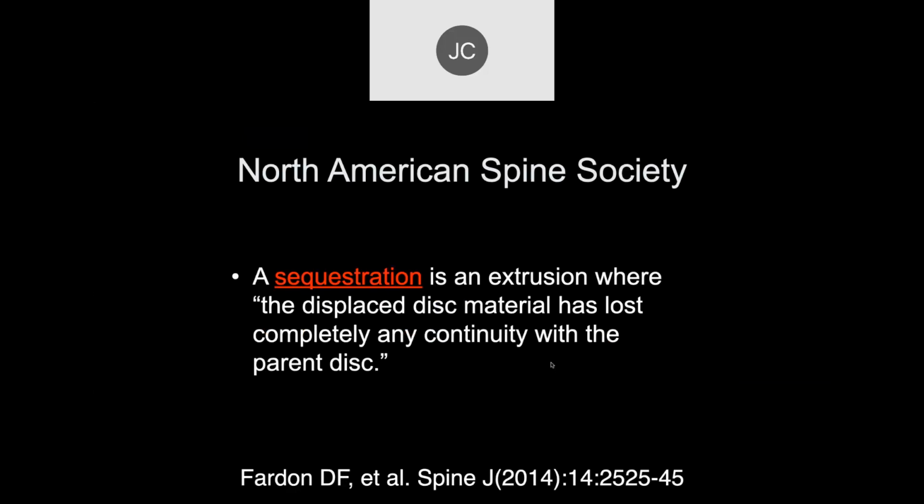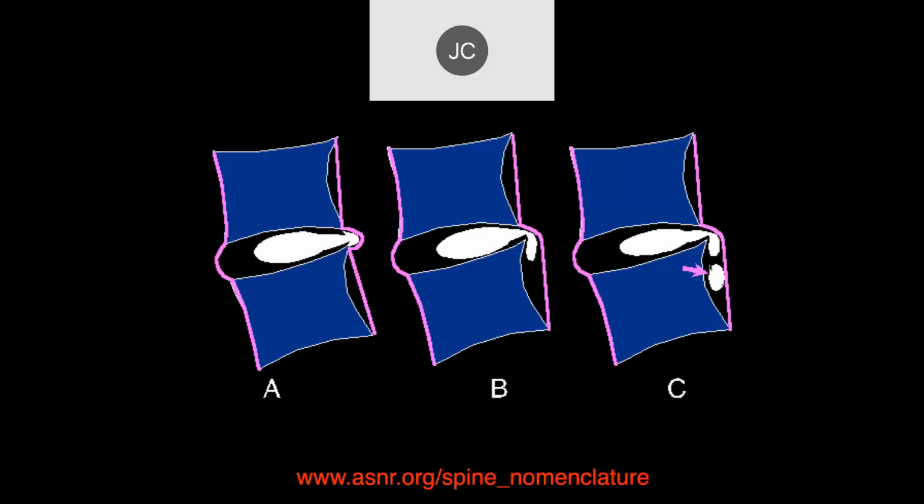And then the final thing is a sequestration, and that's where the extruded material cuts off from where it extruded from and is a separate fragment. This was thought to be very important because it was thought to be something that needed to be surgically excised in the past. Now there are a number of papers that show the vast majority of these will resorb on their own. So it's no longer really considered a surgical condition when you have a sequestered disc, or at least you follow it.